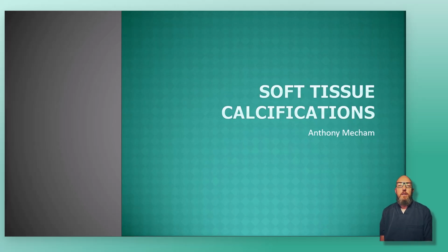Almost everything is going to look white. It's calcified, right? Roundish, asymptomatic. So the whole game here is going to be identification. Where it is is a huge part. What shape it is, does it have layers, and is the patient feeling anything? So if you take one habit away from this video, make it this. When you see an opacity that isn't in bone, ask first: location.